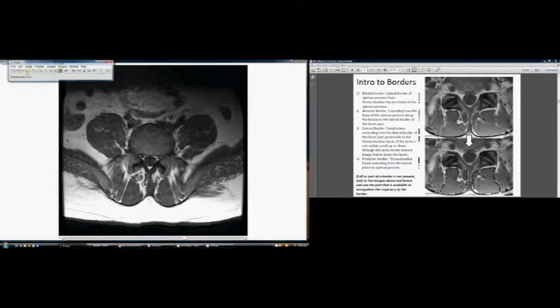We then use the freehand selection tool to outline the multifidus muscle, using the borders identified in the instruction manual. If there's more than one area of multifidus muscle isolated from each other by fatty tissue, we can make more than one measurement using the measure tool to identify the cross-sectional area. Again, we'll use the measure command.